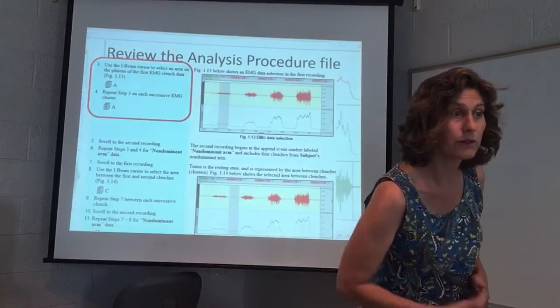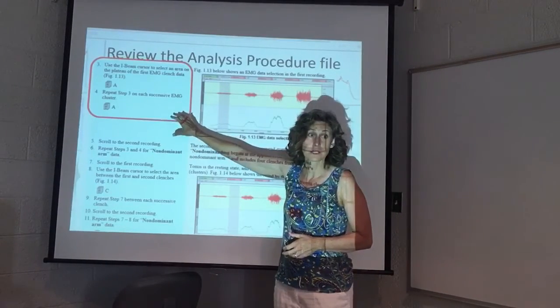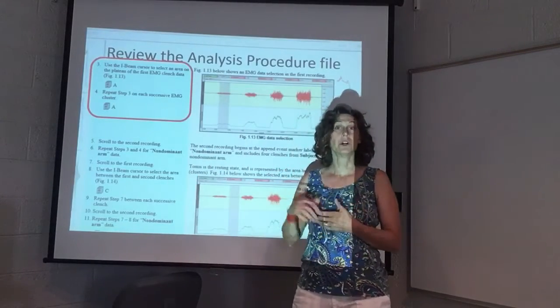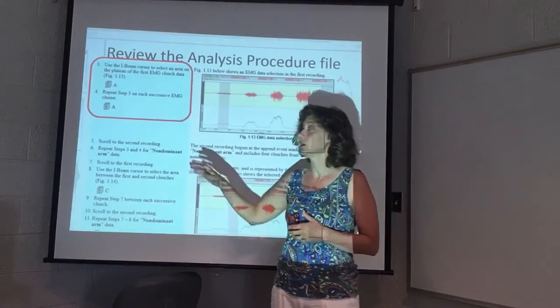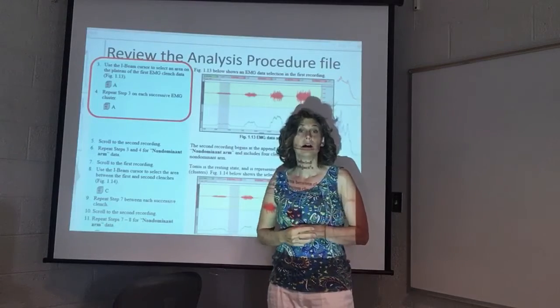And then as you flip through it, you're just going to keep your eye on this turquoise section a little bit. This is guiding you, okay, this is what we're doing now. We're going to use the I-beam cursor, which I introduced in that introductory software section. We're going to use our I-beam cursor to highlight things.